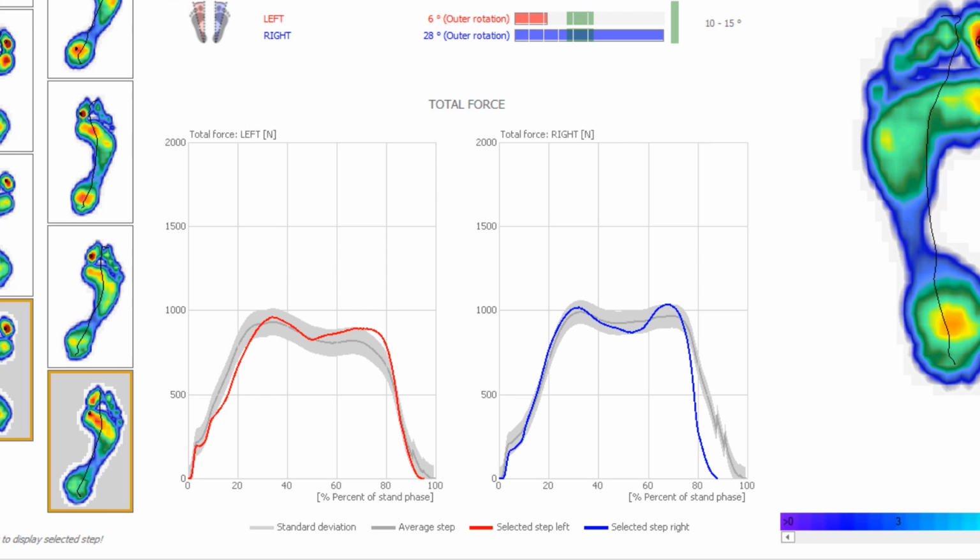A brief explanation of the recording of force via a pressure measuring platform. Technically speaking, a pressure plate also records force. Contrary to the function of the sensors in a force plate, however, these sensors are only able to register vertically running force vectors. On the other hand, this design and mode of operation allows a disproportionately higher sensor density, so that this vertical force can be recorded over the entire sole of the foot and thus become visible as a pressure or vertical force distribution.